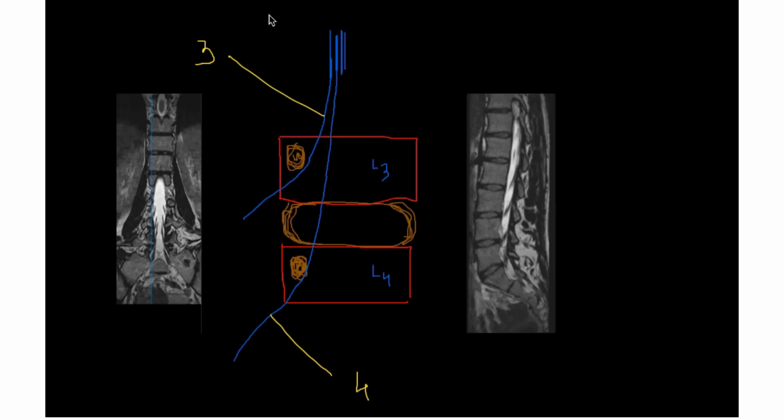When you take a section from the foramen, which nerve are you seeing in the upper part? The exiting nerve. We saw in the pedicle section that there's a pedicle, and just below the pedicle there's a root, and there's some space between the pedicle and the root, which is the epidural space, where we target our transforaminal.